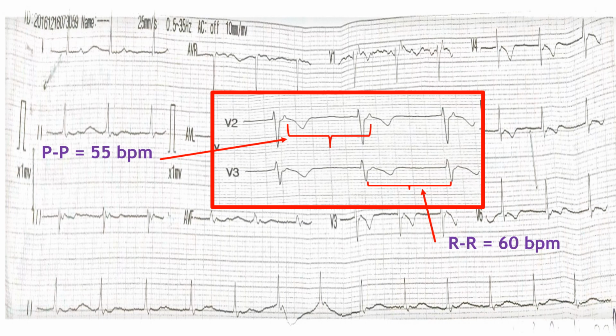But in this case, the sinus rate is slow enough that it cannot influence the faster rate downwards in the ventricle. So although the sinus node is considered the pacemaker of the heart, in this case it has slowed down, and as a result, its influence on the ventricle diminished and was not present. That's why the ventricles started firing on their own. So this was basically a case of sinus node dysfunction.